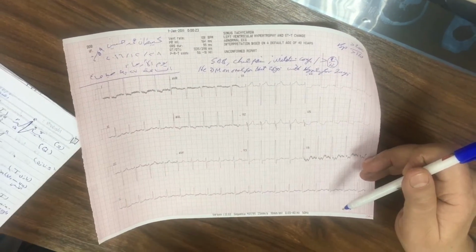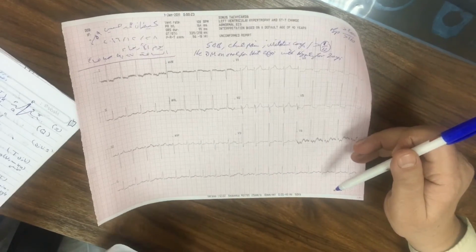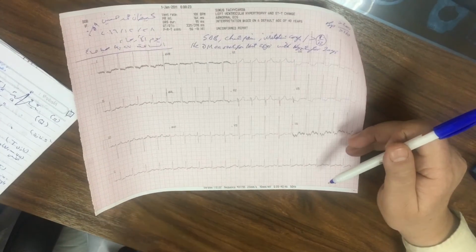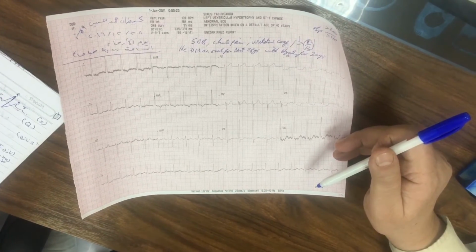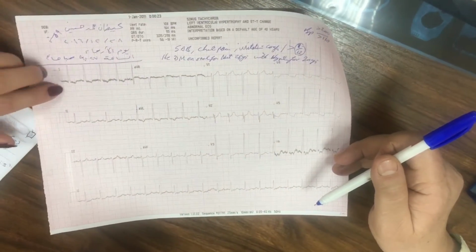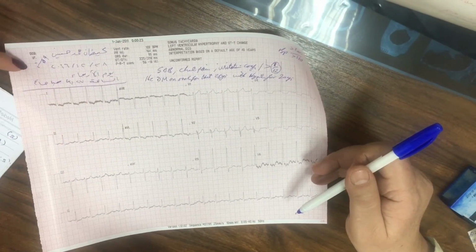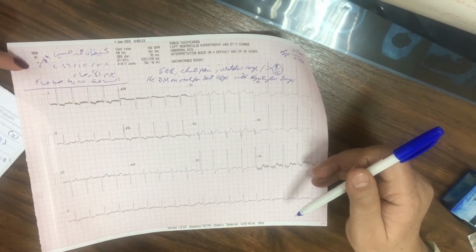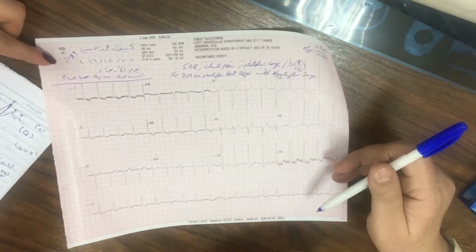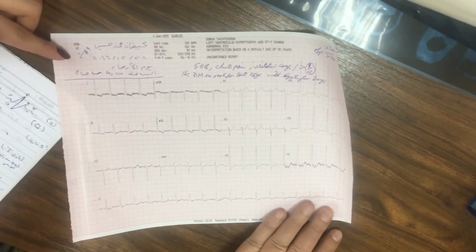Therefore, this patient got what? LVH. It means what? Severe hypertension, aortic stenosis, disease in the left side causing LVH. That's why we get bilateral basal crepitation in this patient on the back. It doesn't disappear on coughing. It means that there is some element of failure in the left side due to the diabetes, ischemia, and due to severe hypertension. Probably he got a renal disease, renal problem.